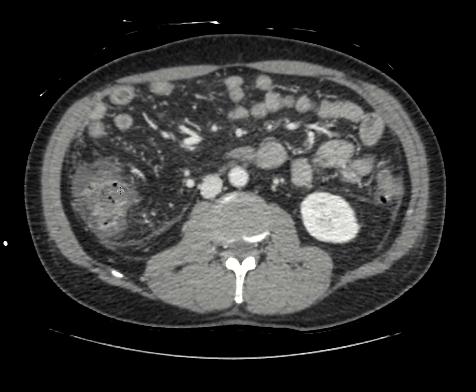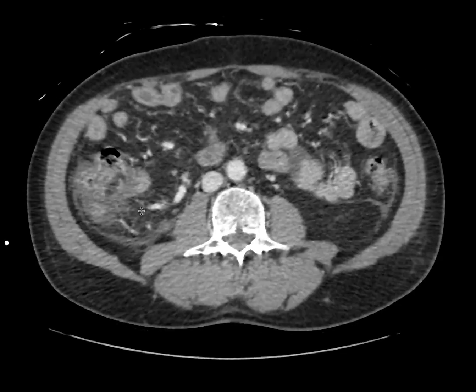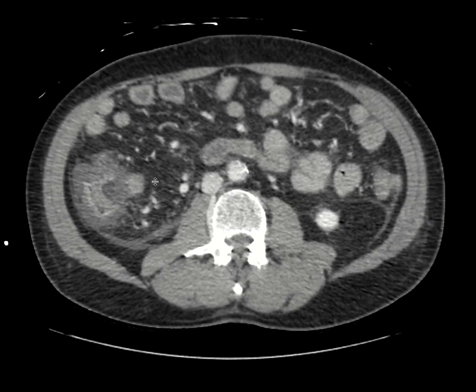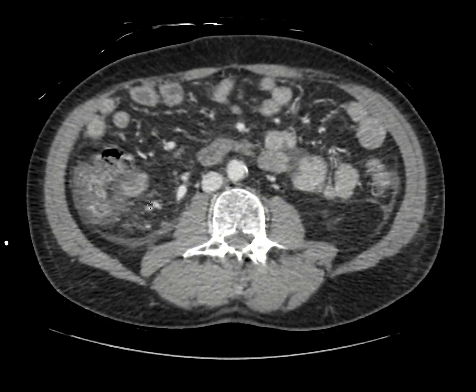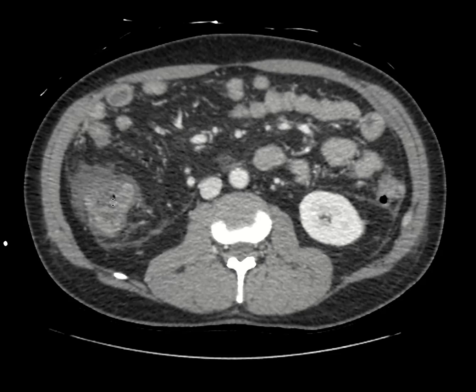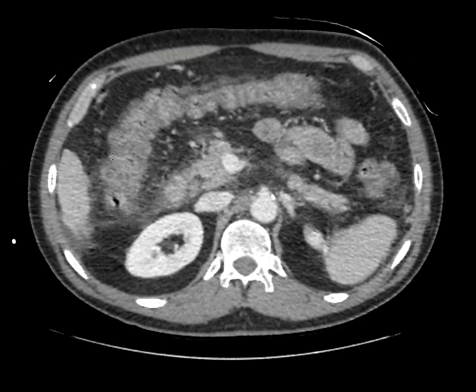The right colon is usually affected more than the left colon, and sometimes it can involve a portion of the transverse colon, but essentially this is just from edematous changes from the portal hypertension, that the venous flow is not able to get back as much, and so therefore you get this kind of thickened appearance and what essentially looks like an inflamed appearance of the colon, but really this is just a manifestation of portal hypertension.